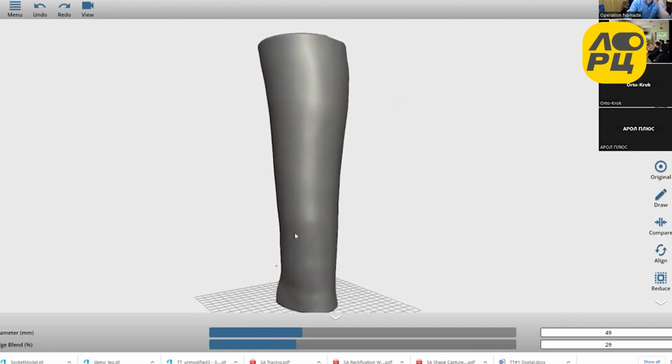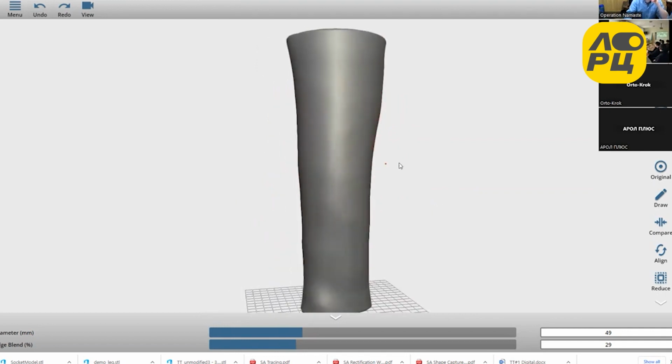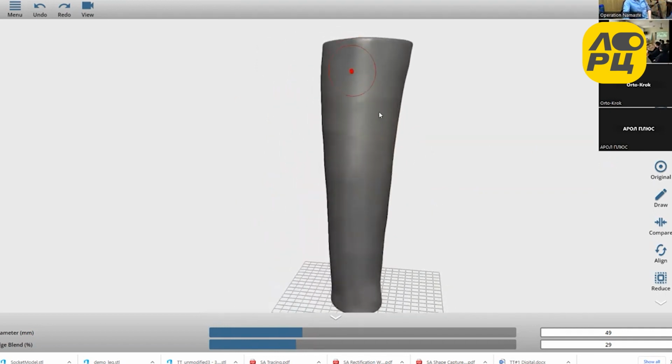Okay, so today I just wanted to show you more or less what I've now shown you, which is that you can take that leg shape from the left, switch it to a right, and use the shaping tools.